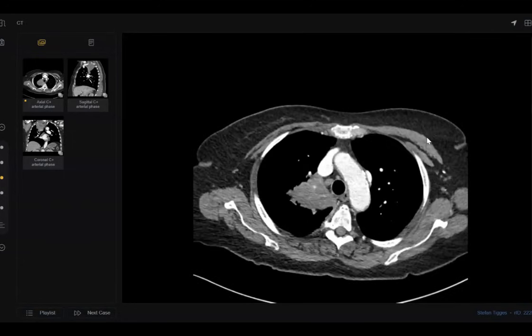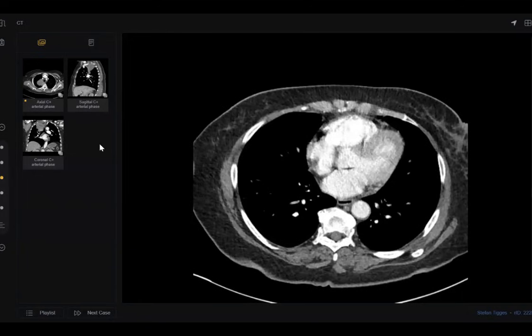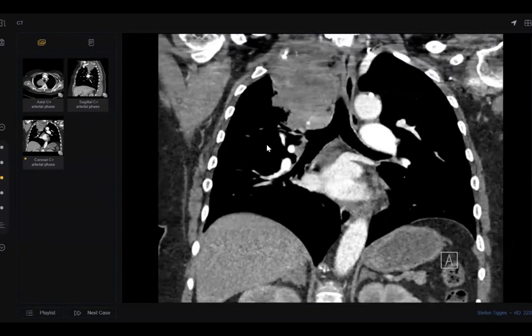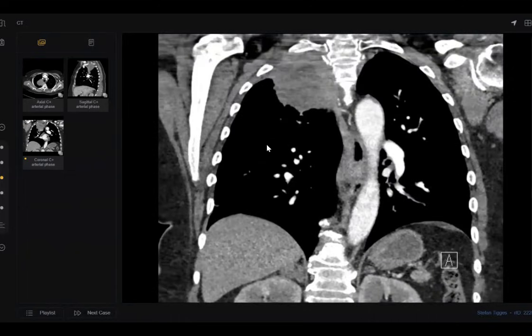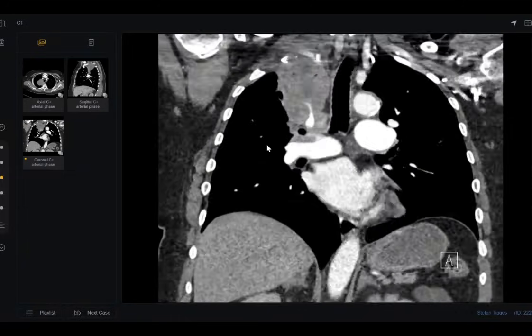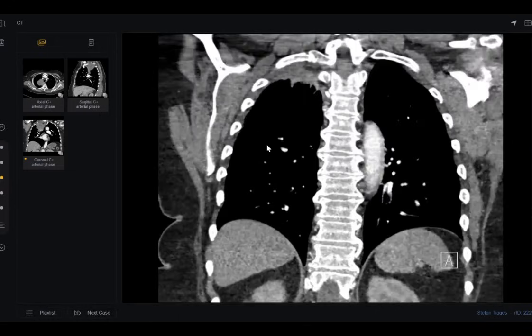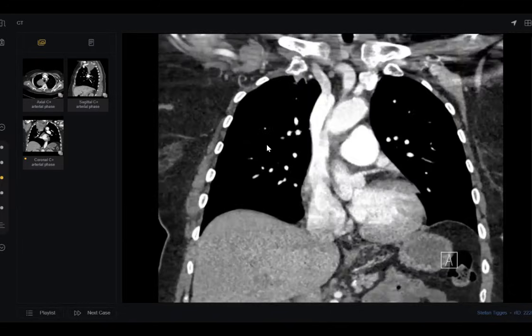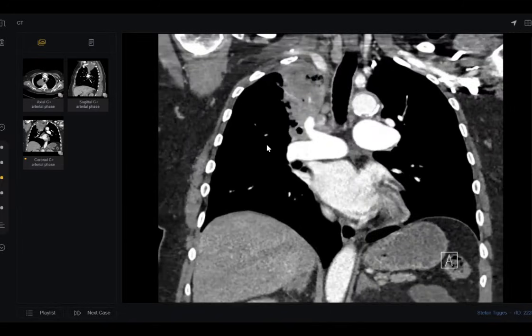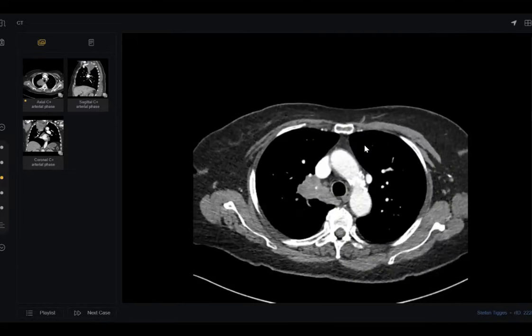Could you tell me? Sir, signs of vascular infiltration. Yes, what are the signs? What is the benchmark of vascular infiltration? Sir, there would be obliteration of the lumen of the vessels, sir. Do you think this is just obliteration? Look, sir, it is invasion.